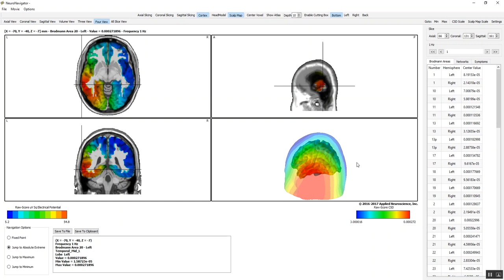And so one takes multiple measures, gets the variance, divides the variance into the current source density in this case. And what this means is that if there's a large amplitude or high current density in a given location, but there's high variance, then you will not see the event. If, on the other hand, there is a high current density value and the variance is low, then you will see the event. It's a probabilistic way to sort out of the large mass of voxels those that are most relevant for a given subject or a given experiment.